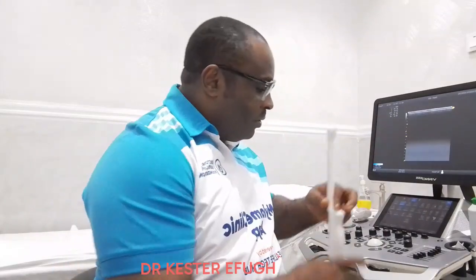Strictly speaking, they are not the same, but practically, where you have this probe, you can also use it for transrectal scans. So, strictly, this is a transvaginal ultrasound probe. The frequency is usually from 7.5 megahertz and above, some get up to 12 megahertz. So it is used for transvaginal ultrasound.